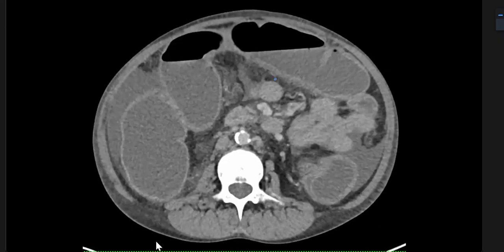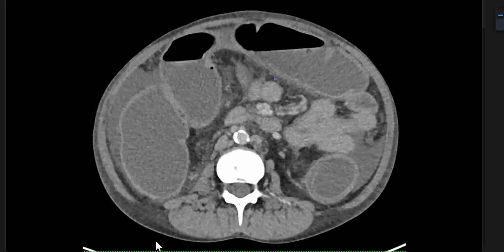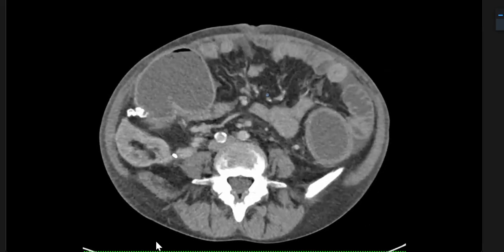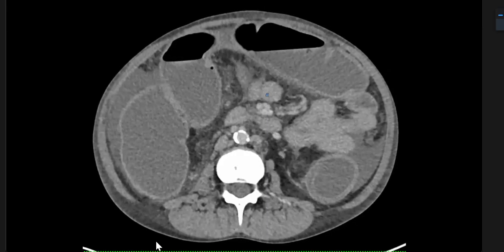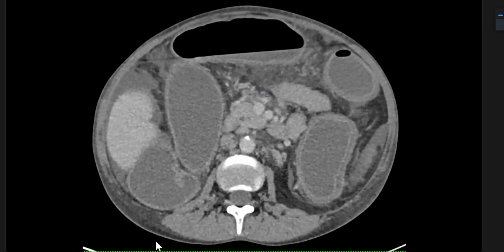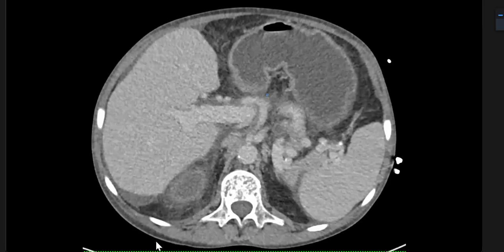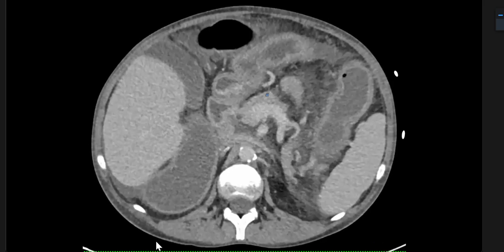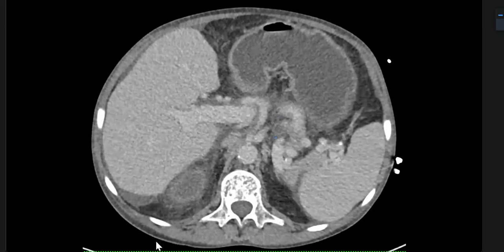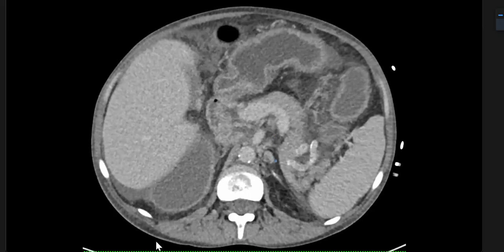Secondly, you have somebody whose kidneys you couldn't see. You were worried about the left kidney, nephrectomy. How about the right kidney? Both native kidneys are atrophic, completely atrophied. This is the adrenal. Can you see this? This is the left kidney.